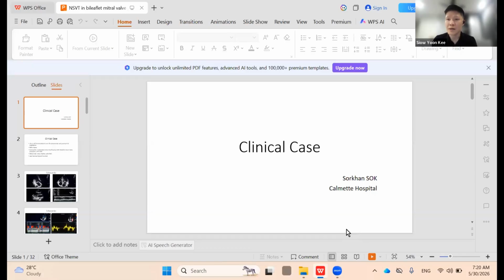Generally, I think this is a great case to illustrate a very young patient with Holter findings of salvos, bursts of PVCs, where we definitely have to do something. And I think medicine-wise it is a bit tough because the patient already started with a sinus bradycardia.